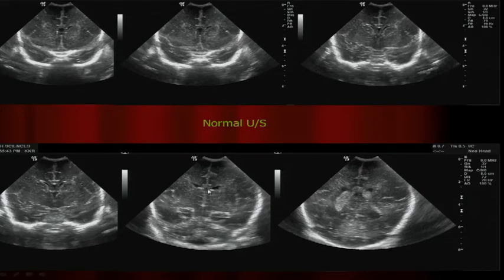So here, the choroid plexus. Where does the choroid plexus not live in the ventricles? It does not live in the frontal horns of the lateral ventricles. And it does not live where else in the lateral ventricles? Occipital horns. It does not live in the frontal or the occipital. What it does is, in the roof of the third ventricle, it goes to the foramen of Monro. Then immediately it goes back along the floor of the lateral ventricles into the body. And then it goes over here to the atrium or the trigone, and then it goes into the temporal horn. It does not go in the back, and when it goes through the foramen of Monro, it does not go forward.